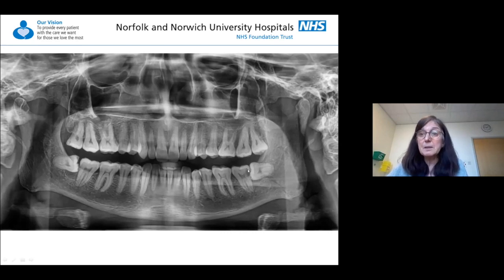Now this is dental decay, demineralization of the tooth as a result of carious bacteria, and not being able to clean the gap adequately between the wisdom tooth and the second molar. Now you can see this dark shadow is rapidly approaching the pulp chamber in the middle of the tooth. As it gets closer, bacteria will go along the dental tubules. The process will be set up in the pulp, and at that stage the patient gets raging toothache, really throbbing pain that's enough to keep you awake at night.